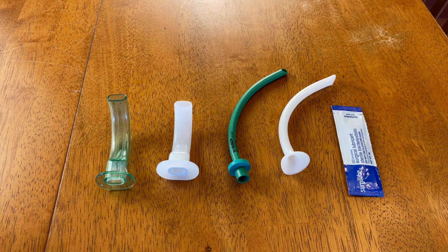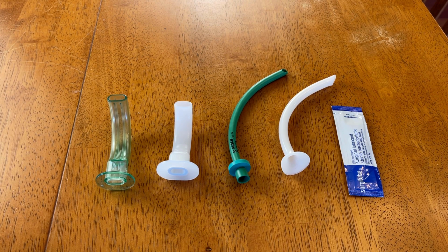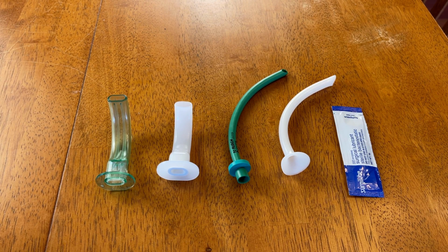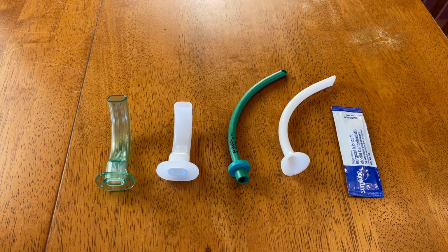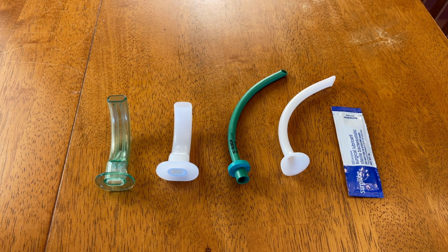So let's start by looking at the NPA first. The NPA, which is designed to be placed, of course, through the nose and displace some of the soft tissue with the purpose of really facilitating air passage through the pharynx and eventually down to the lower airways. But the NPA can also serve as a conduit for passing a fiber optic scope or even performing suctioning on your patient. Now, when we look at the anatomy of the NPA, there are just three basic components.